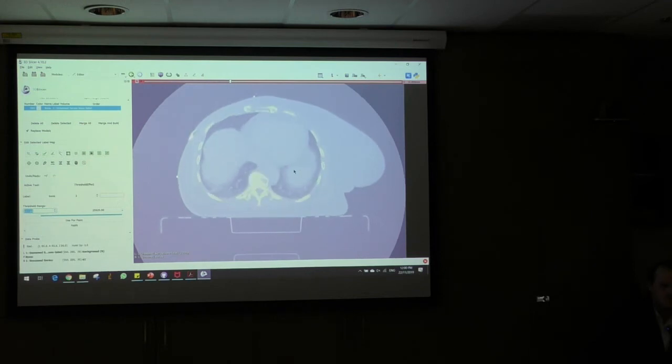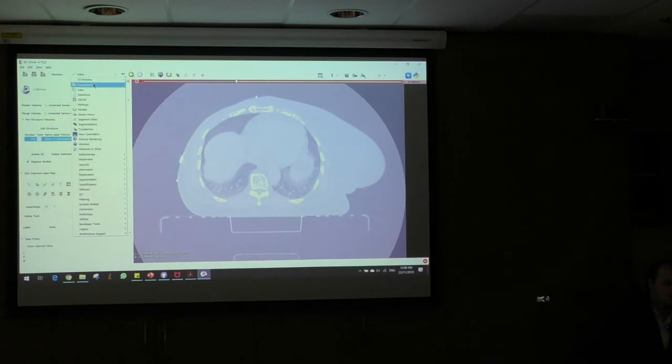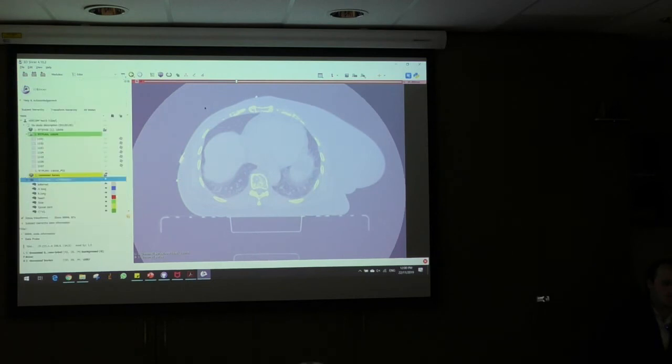But once you do get it right, you can see that most of the bone is selected there, and then you're able to go through each individual layer and remove the excess features that you're not after, basically. And so we can just hit apply, and it's more or less selected most of the bone material. And then from here, we go back into the data menu module.